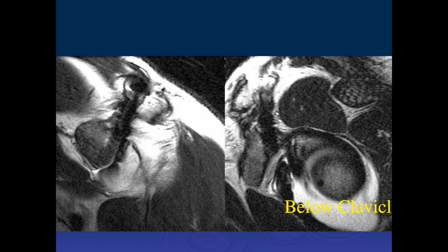So this patient had surgery. It looks like they had repair of the coracoclavicular ligaments. A lot of times they do a tightrope fixation. They connect the coracoid to the distal clavicle. Yeah, there are a number of fixations here. We can see that there's a metal artifact going all the way through here.